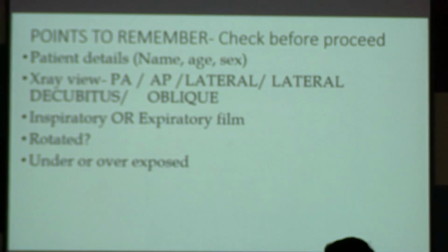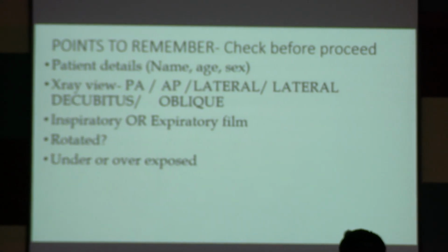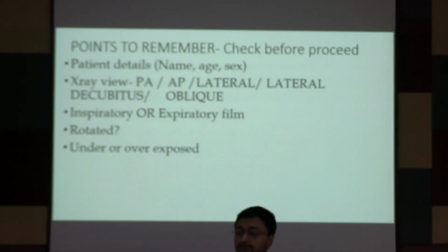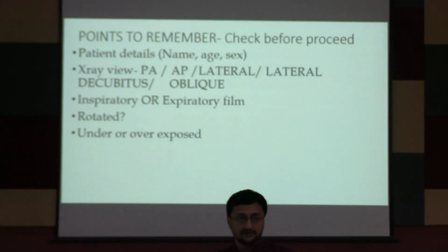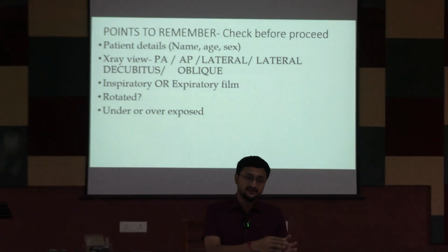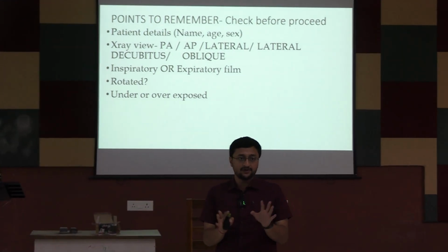So, points to remember before reading a chest X-ray. That means, very frequently it has been observed that the X-ray film is misplaced, right? So this is a very common error.